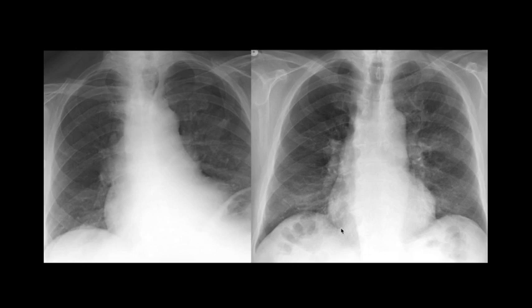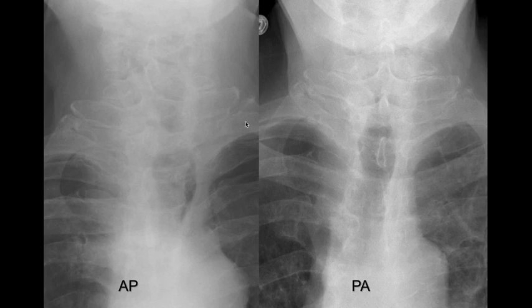There is a way to identify if a chest X-ray has been obtained portably as opposed to PA, and this was described by investigators in the past, in which the AP technique enhances the joints of Luschka and the anterior and posterior vertebral aspects of the bodies. The PA radiograph, on the other hand, accentuates the posterior elements in the transverse processes, and this is how one can utilize these signs to differentiate the two projections.